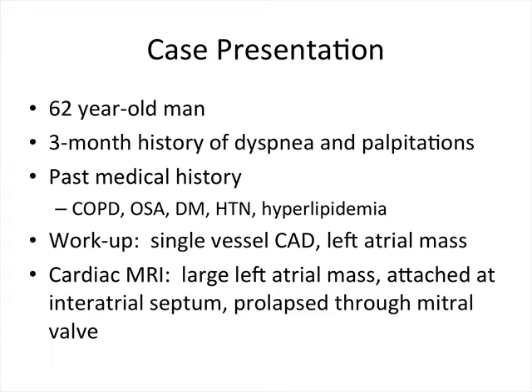He underwent a cardiac MRI, which revealed a 5 cm by 3.3 cm by 2.6 cm mass with central necrosis that was attached to the superior interatrial septum and prolapsed into the left ventricle across the mitral valve during diastole.